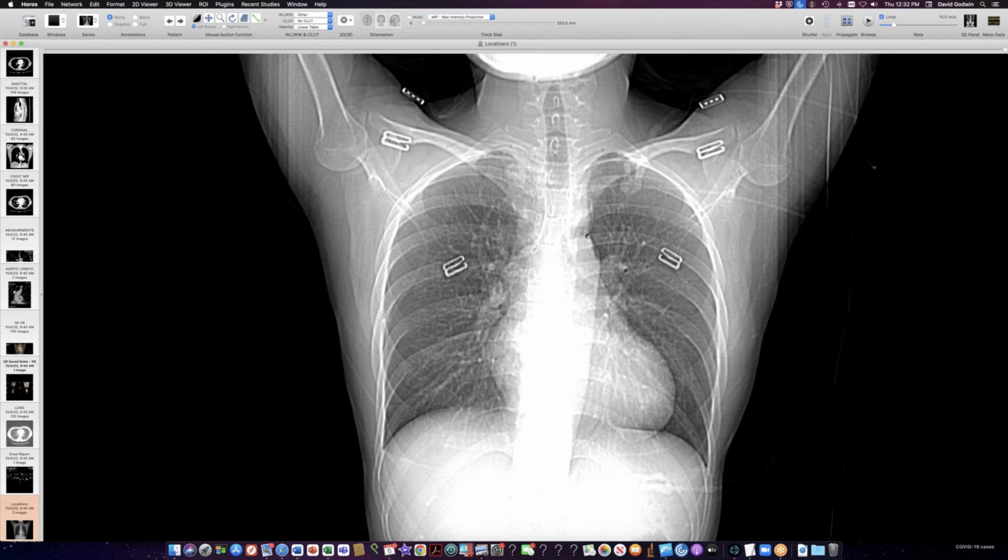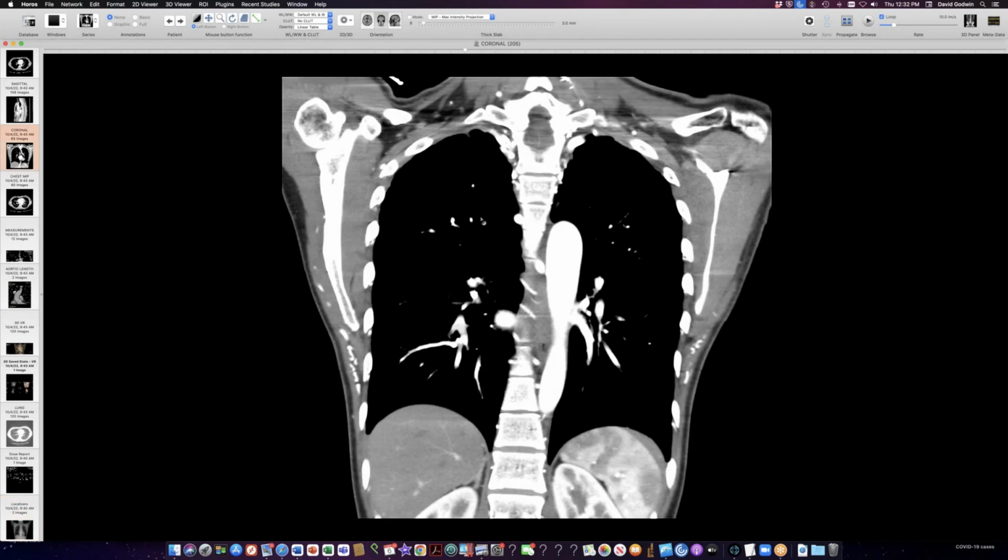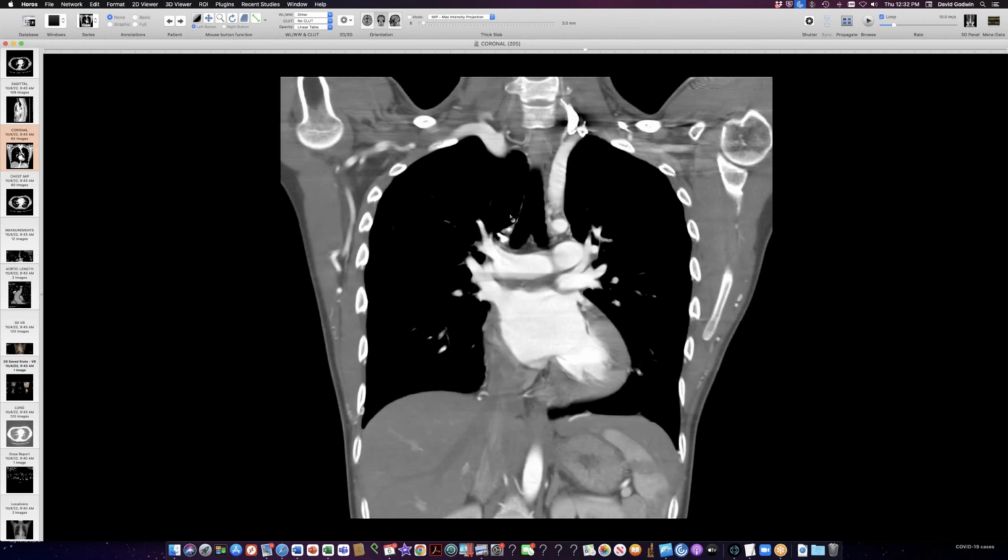So this qualifies. It's this area here. Maybe that's notching. It definitely has an intact cortical line that you can see, and it seems to be a little concave, so actually fairly modest. It's possible to overinterpret this as the 3 sign, but the 3 sign is supposed to be the narrowing underneath the aortic arch and then poststenotic dilation below that.